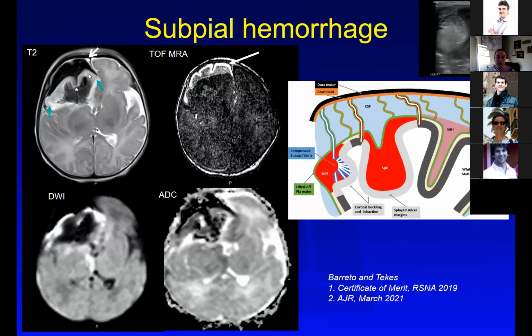Therefore, they develop cortical infarcts and subcortical white matter infarcts. And as you know, the white matter venous infarction has a high likelihood of hemorrhagic conversion in any age group. So that's what we see here, really. Diffusion weighted imaging correlates with the infarction in the cortex, and you can see the signal drop on the cortical layer here too.